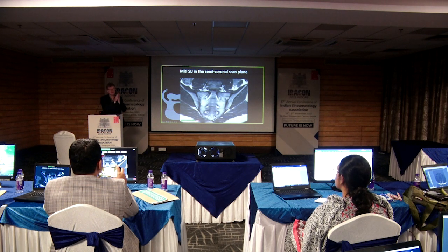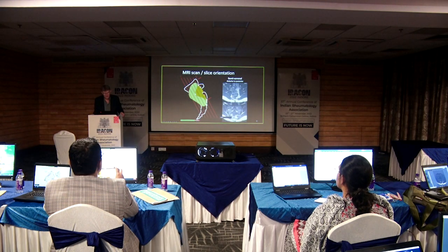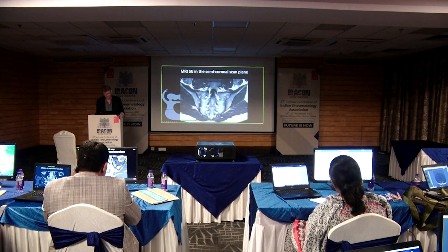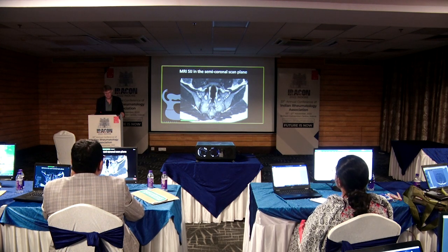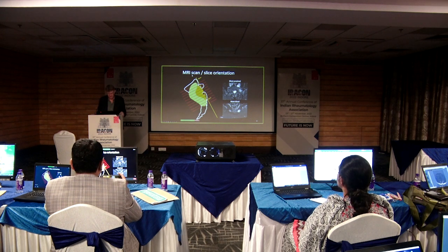That is because we've come so far back that we are in the hole of the boomerang. You say that we have reached this area here, where you get into the ligamentous compartment. So when you go there, the further you get back, there's less and less cartilaginous joint. There's still a bit down here, but as you go further back, it will become all ligamentous. You're now outside the cartilaginous part, and you go so far back that you can see the spinal canal here. So that is the most important way of obtaining images, this semi-coronal or oblique coronal aligned with the sacrum.